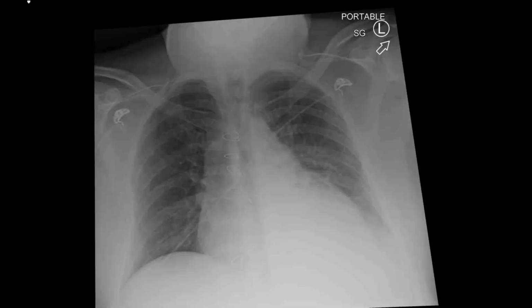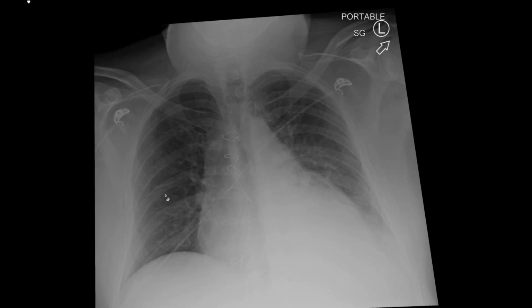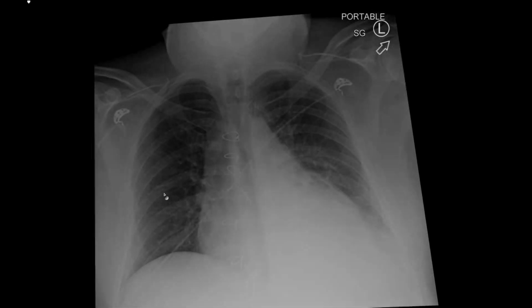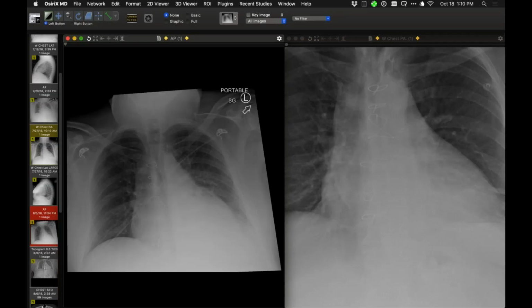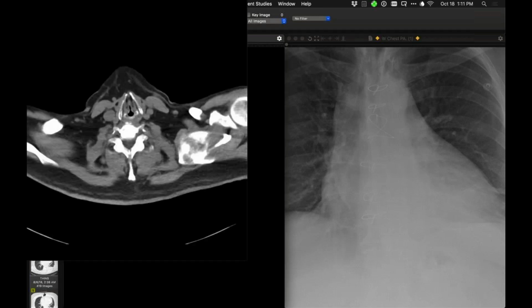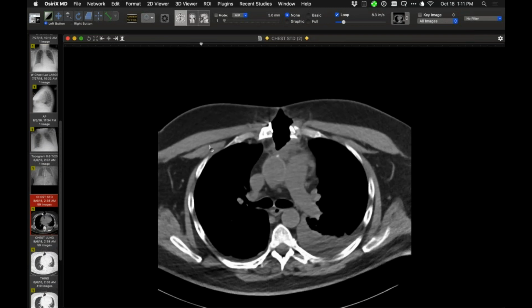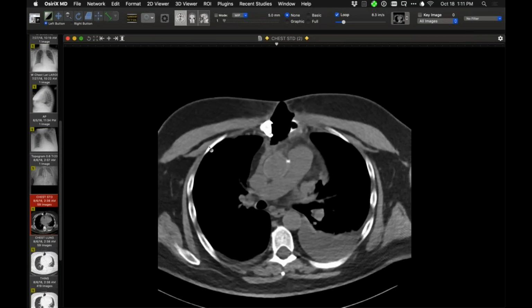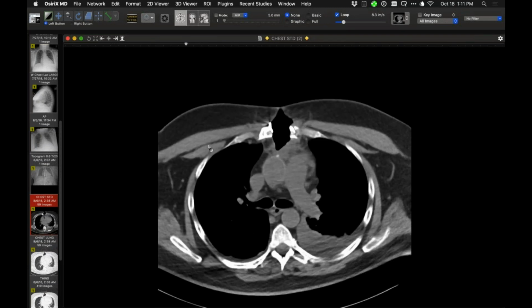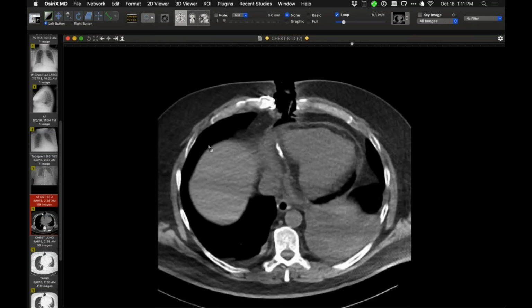I'll show you a radiograph from the 5th of August. And now you can see all these sternal wires have moved rightward, and a substantial gap has appeared to the side of them. And indeed, you'll see that there is substantial abnormality of the sternum, with the wires moving rightward with the right half of the sternum, but otherwise the sternal incision is quite dehisced.